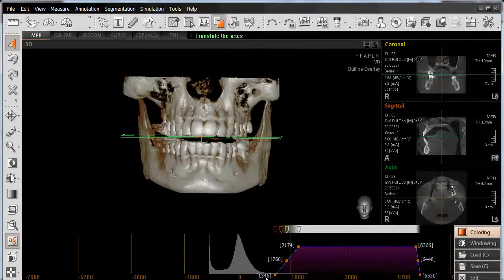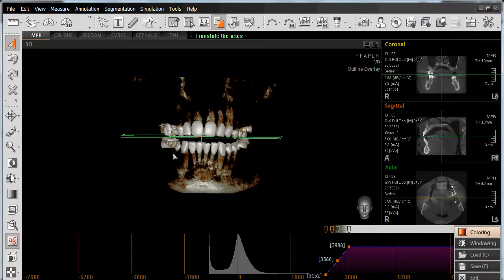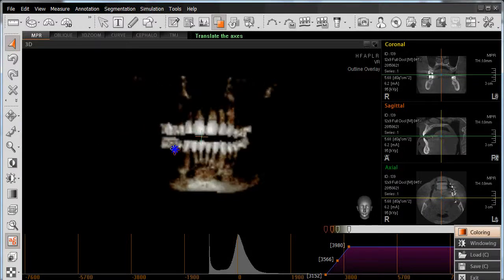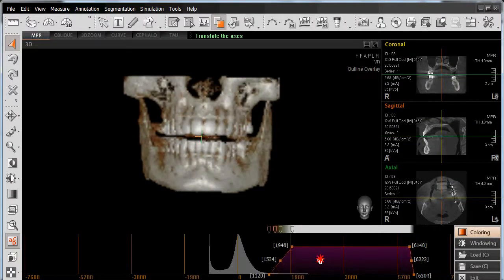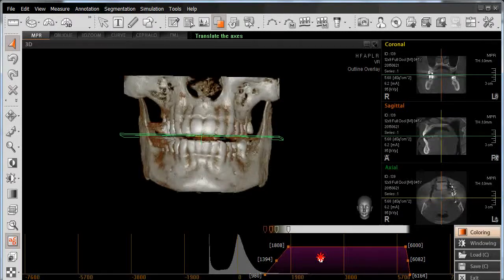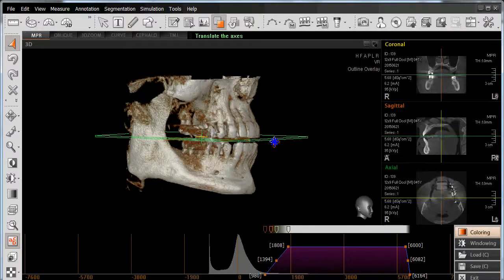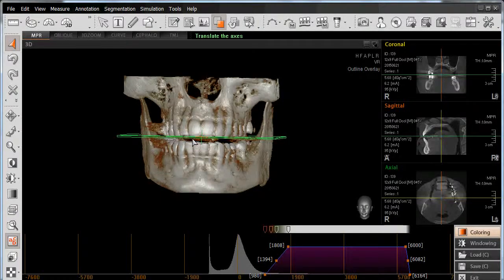Cortical bone typically starts right around 1300 or 1200 or so. If I left click and continue to the right, as this value gets higher, I begin segmenting out any density below this number here, roughly 3100. Left click and slide to the right or left until you have your desired density range established, and then from here we'll move on as far as establishing our color range.